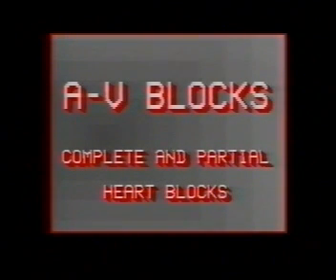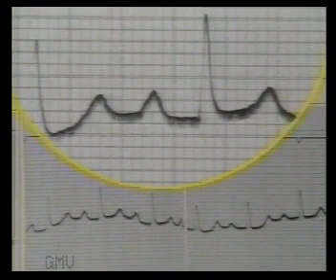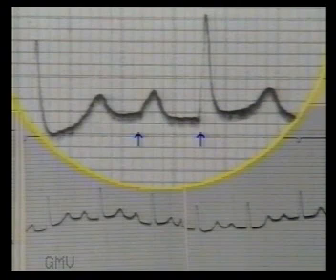AV block, complete and partial heart blocks. First degree AV block, or first degree partial heart block, or a block in the AV node. In this ECG, measure the PR interval. It is 6 small squares or 0.24 seconds.